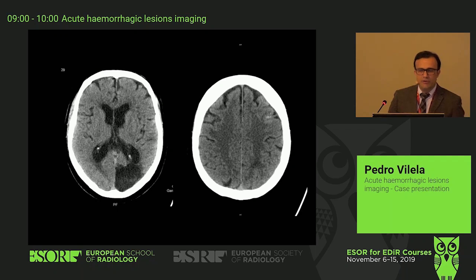So your colleague already pointed out amyloid angiopathy, especially in elderly patients. But we can have other situations, like cavernoma, which is rare, cortical vein thrombosis, vasculitis, reversible vasoconstriction syndrome, dural arteriovenous fistula that can be very superficial, okay?